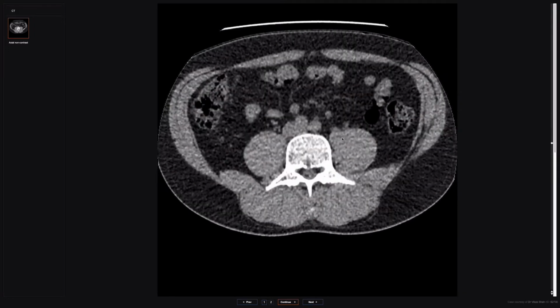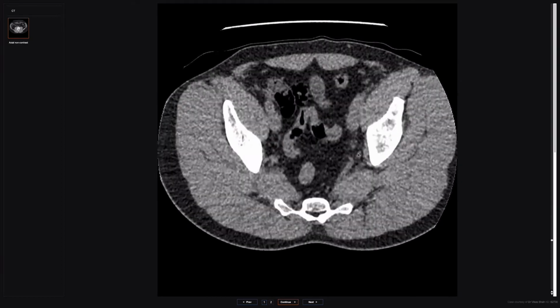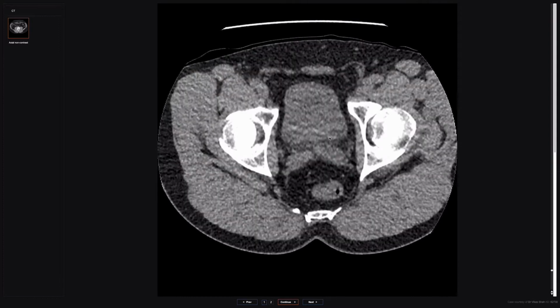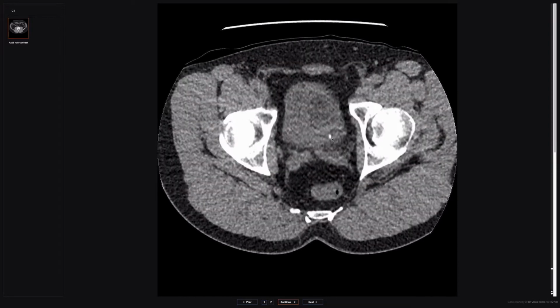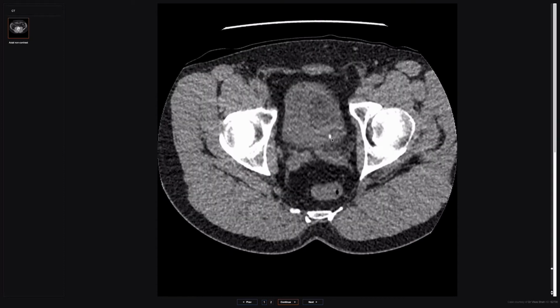And then as you scroll down, the left ureter, which is here, is distended. And hopefully we can track it all the way down to a stone. And this is the reason we do these scans prone. Because by turning the patient prone, this allows us to differentiate whether this stone is free within the urinary bladder or still contained within the distal ureter but just prolapsing into the bladder at the VUJ.